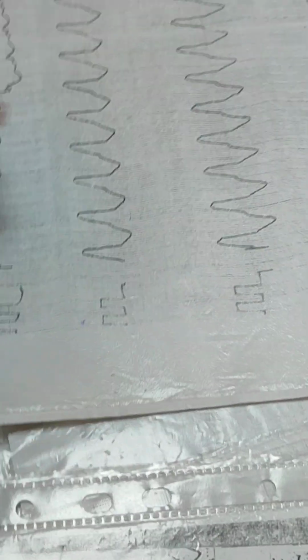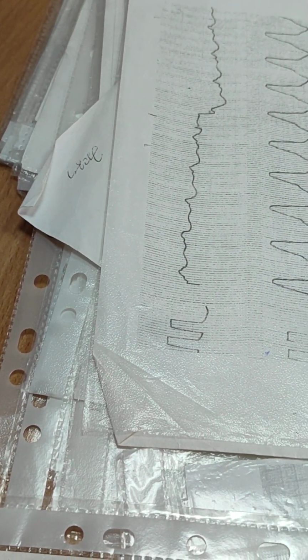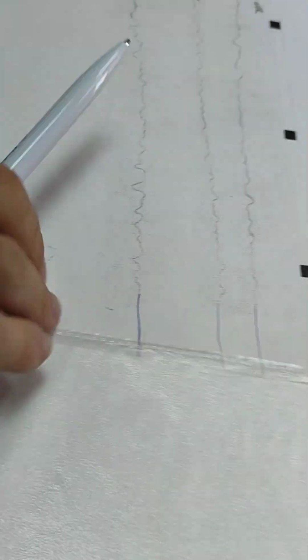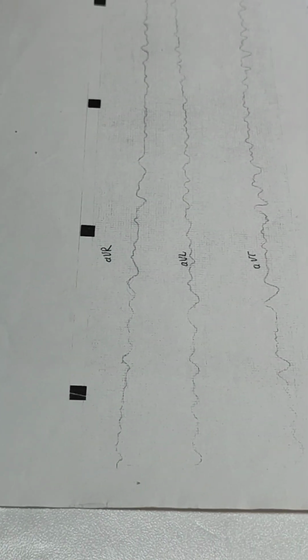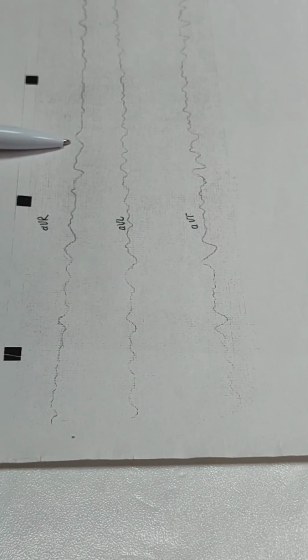What is it? Which one? Ventricular. Why deformed complex? And this one? It doesn't matter in which side to turn it. Everything is irregular. No clear complexes. It's not atrial, it's ventricular fibrillation. Ventricular tachycardia, next ventricular fibrillation, next asystole, and the patient is dead.